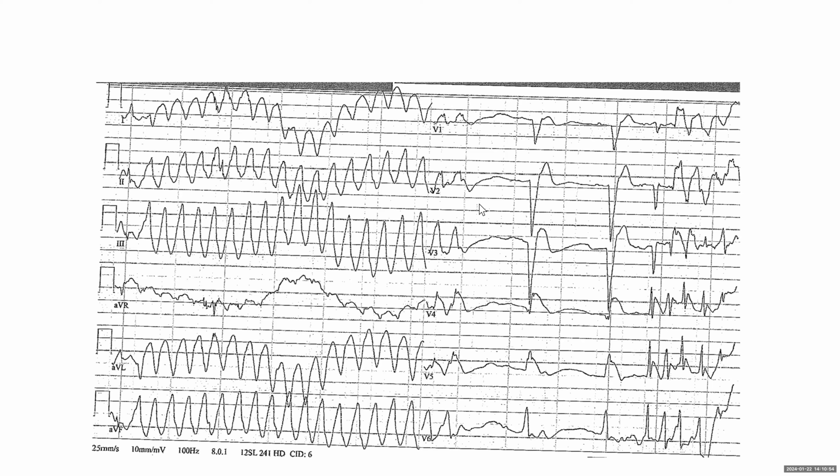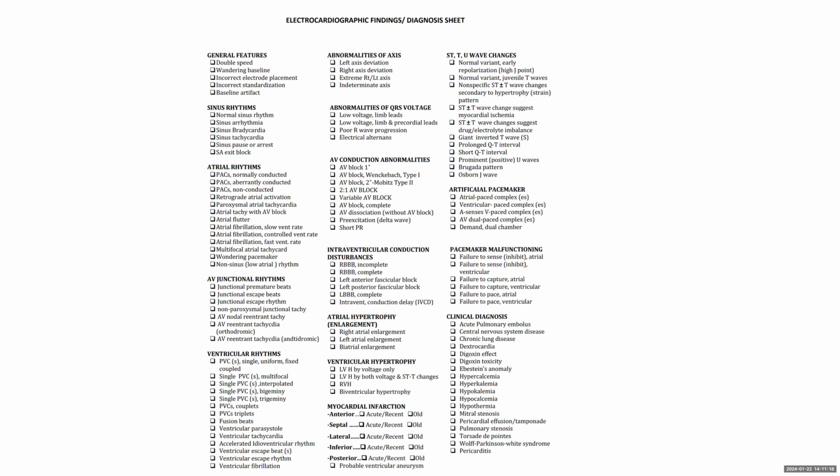Dr. Marwa is a world expert on QT and correction. So if I say anything wrong, Marwa, you correct me. Excellent. Any other questions? Not prolonged, clear in V6. Yeah, clear. Okay, good. Next ECG.